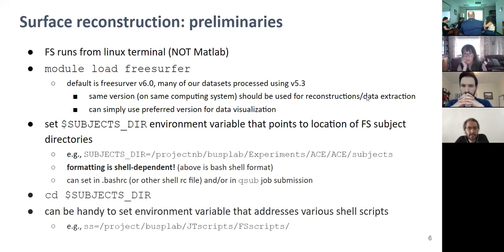Labeling and extracting the information from the labeled data, like ROI. You can pull out individual ROI masks. You can pull out volume, thickness, that sort of thing. That may be a little bit conservative, but my recommendation would be to just always do that with the same version. Okay. Let that version of FreeSurfer, whatever's under the hood, do that.